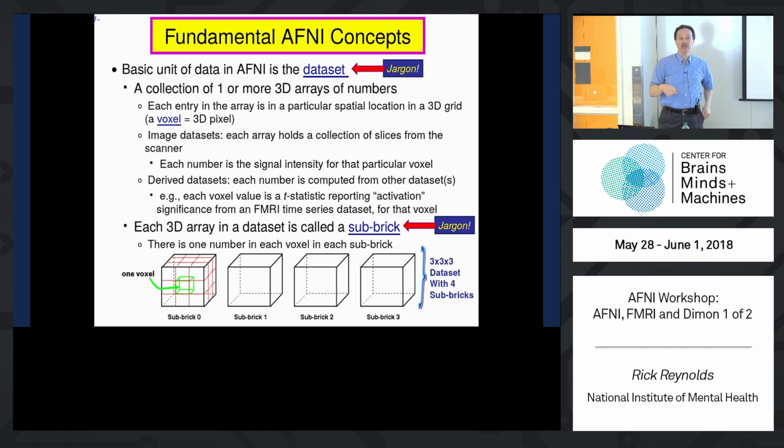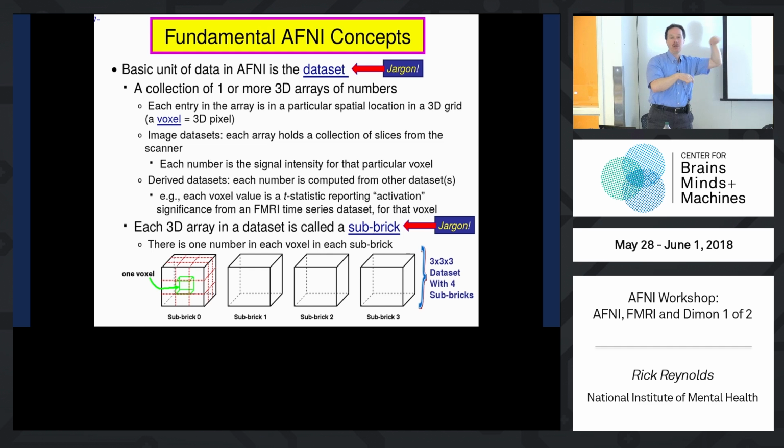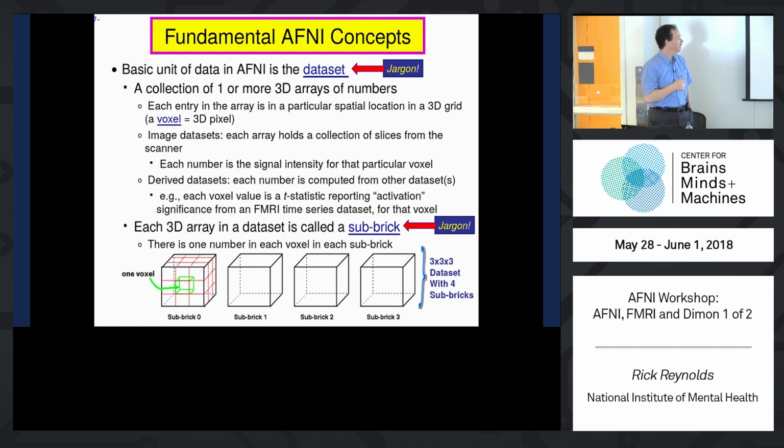The storage of them is usually spatial first, in that you'll have all of this direction's points, then you'll move back along your axial plane, and then you'll collect the next set of points. So this is how they're stored on disk. And then you move to the second time point and you start over. That array is how they're actually stored linearly on disk. But you'll visualize it in this three-dimensional volume.